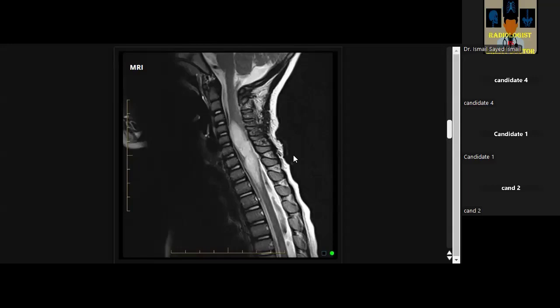Secondly, astrocytoma also involves more spinal segments, I think. And astrocytoma is predominantly eccentric, and ependymoma is central. You can get another differentiating point from the appearance of the vertebrae. Appearance of the vertebrae? Yes, adult or child.